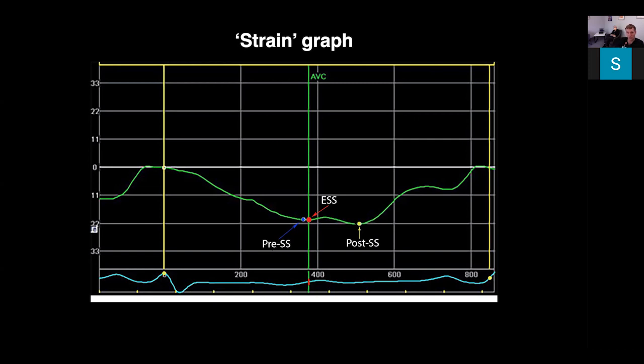Anything that happens after it, as in post-systolic shortening, would be inefficient contraction. And this would be something that might be considered a heart that is not contracting in a positive manner, maybe, okay? So even on one simple curve, we can get different ways of assessing what strain is.